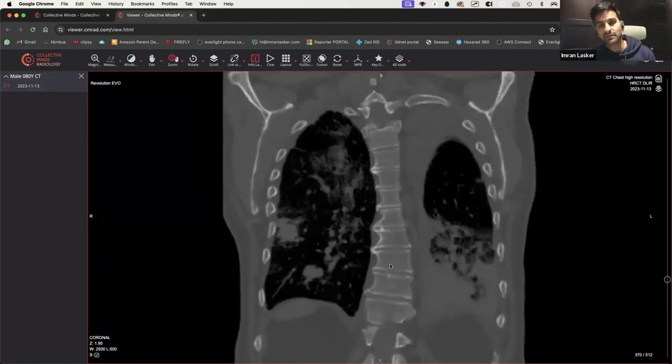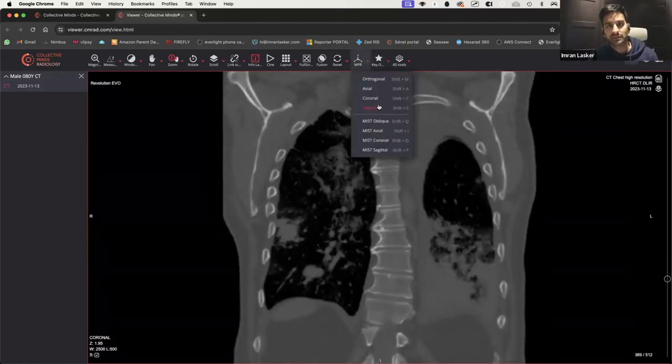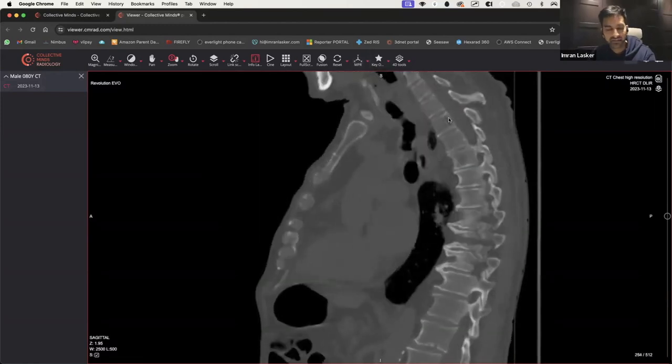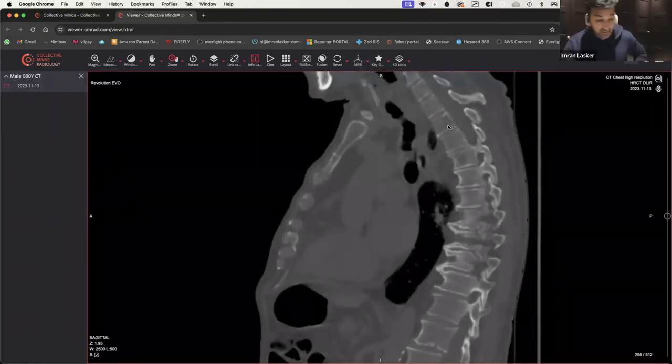And so now here, because we know this patient's got malignancy, we've got to really try and see if there's any sort of destructive bone lesion. And you come to this area over here. What are people saying? Right renal vein distended. Yeah, I was going to go on to that.